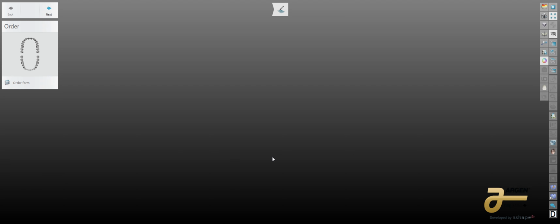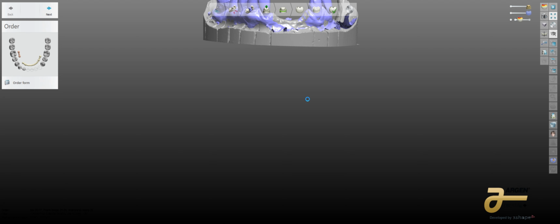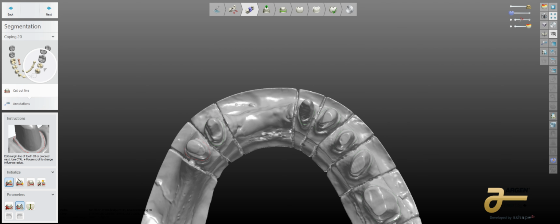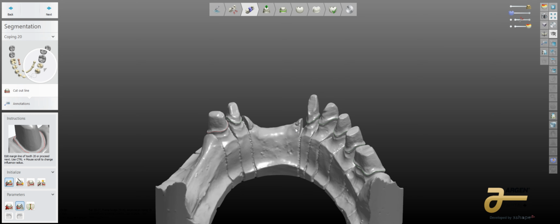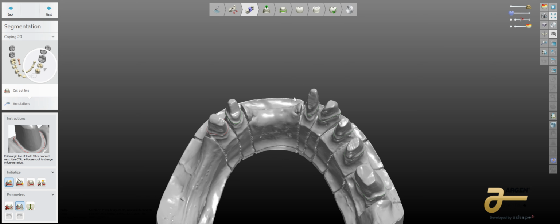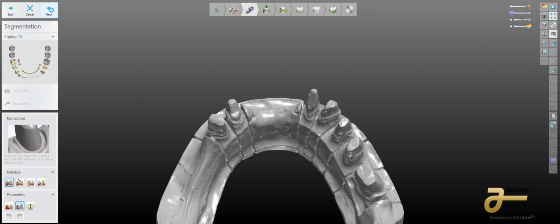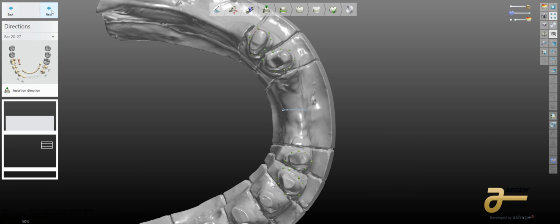And remember, as we're bringing this into this feature here and it's propagating this, all of my videos are done in a fashion to get you engaged in understanding that I'm not going to edit anything. This is a one and done type of situation. I'm running through it and talking through it. So the first part of this is just setting insertion and getting the margins lined. This is rather dry and boring. I'm going to go ahead and just click through here as fast as I can and just continue to talk a little bit about this stuff.